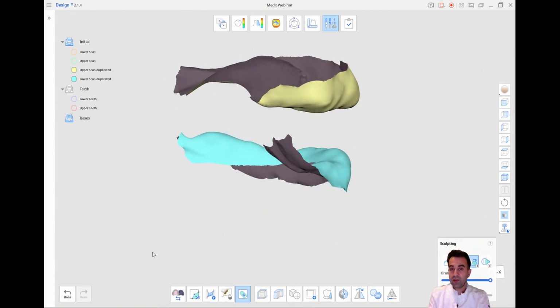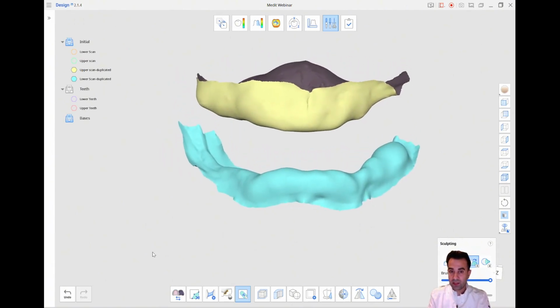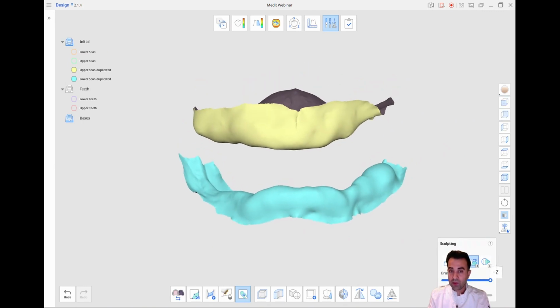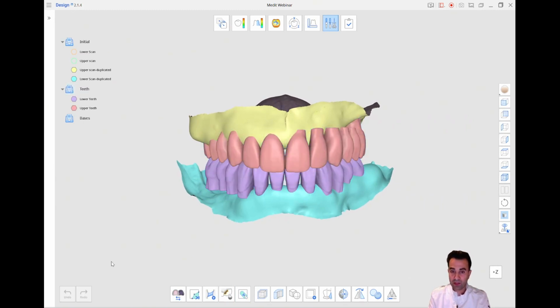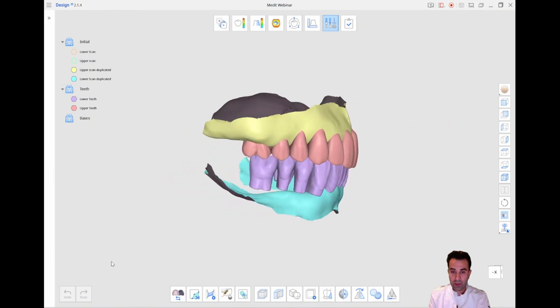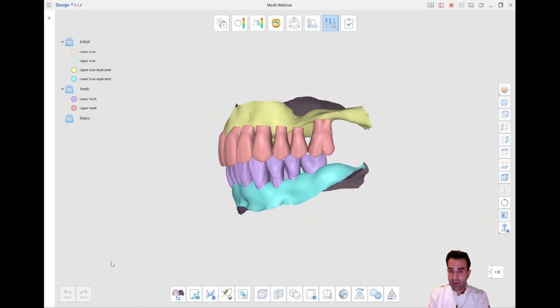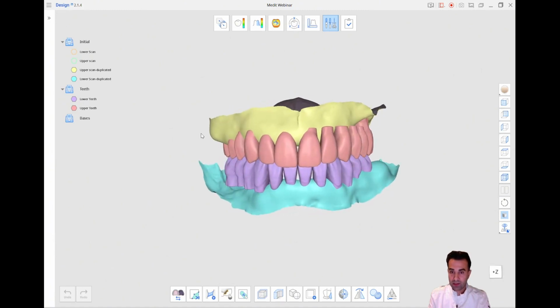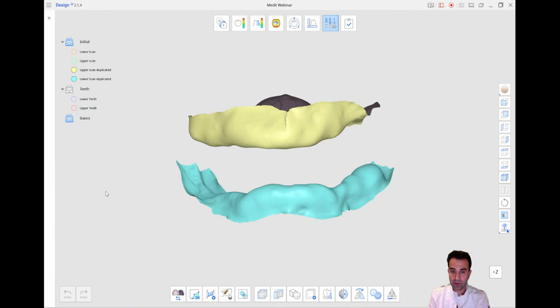And the nice thing about digital dentistry, and that's why I like immediate dentures, is that we managed to preserve the vertical dimension and the horizontal jaw relation. So we didn't need to capture CR, centric jaw relation, or to measure the vertical dimension. That's what makes immediate denture a two-visit procedure. First, we take the scan, and then the second appointment will be extraction and denture insertion.